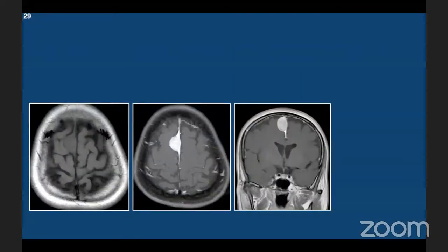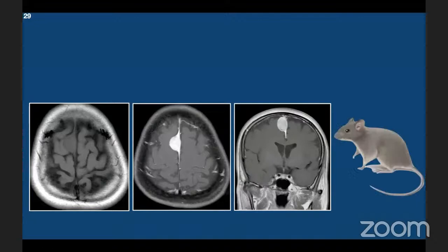This is a case of meningioma with intense contrast enhancement. On MRI, the thickened enhanced dura may resemble tail of a mouse extending from the mass. So it is known as tail sign. Dural tail was initially thought to be resulting from direct invasion of the dura. However, subsequent studies proved it's a reactive process.